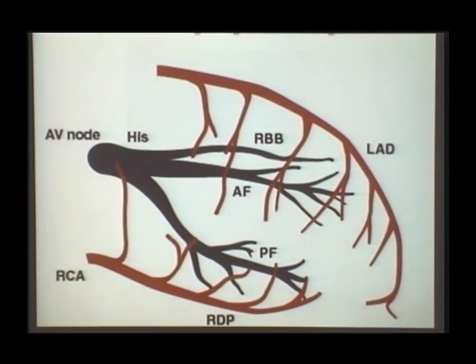One important ECG manifestation: when you see the serial ECGs in an anteroseptal infarction, on the second day and third day, the patient will start developing a left axis and left anterior fascicular block. Very common finding in an anteroseptal infarction because it is supplied by the left anterior descending. So these two fascicles are anatomically related to one another and they are supplied by the same artery. That's why the combination of right bundle branch block and left anterior fascicular block is very common.